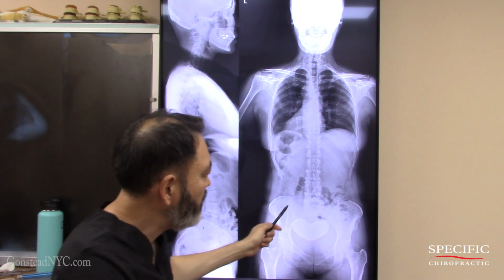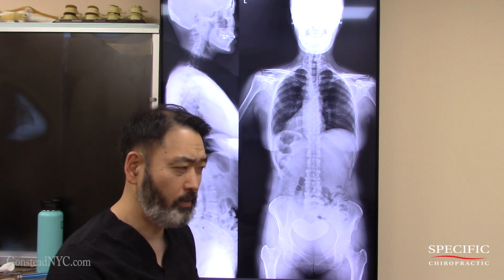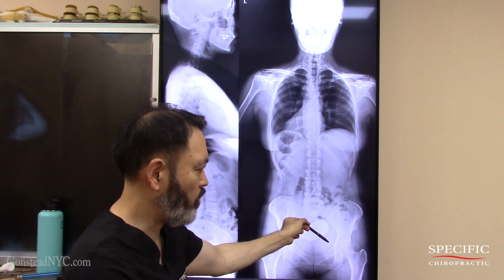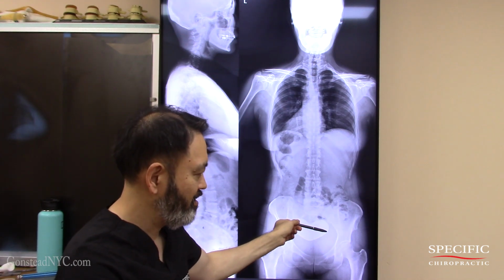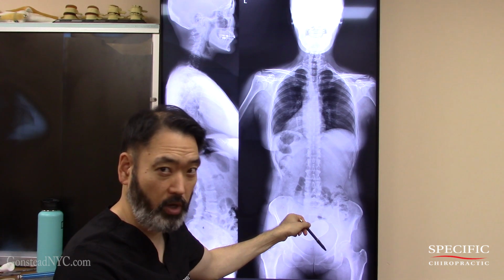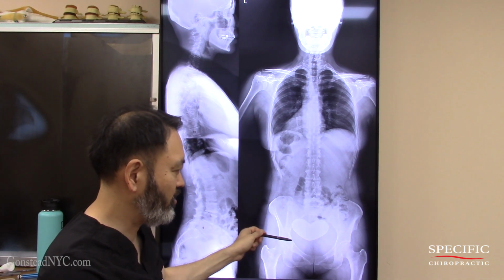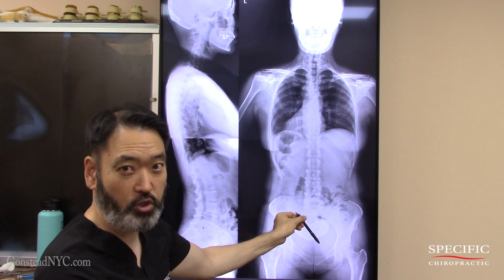Now, that being said, we've got an interesting curveball, something that doesn't add up. If the femoral acetabular line over here is sinking out this way, and we adjust that AS-IN, what's going to happen is it's going to sink down even more this way. That's a problem. Same thing with this one. If we adjust the PI-EX on the left side, and it's already here, it's going to tilt out even more this way.